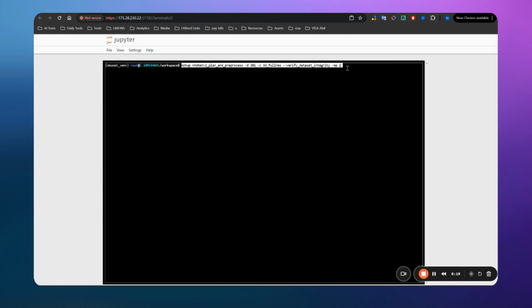Okay, but now I need to change a few things. As I said, this first part is to run the process in the background. Then we have nnUNetv2_plan_and_preprocess. This is the command that will run the pre-process and prepare all the arguments for the training.